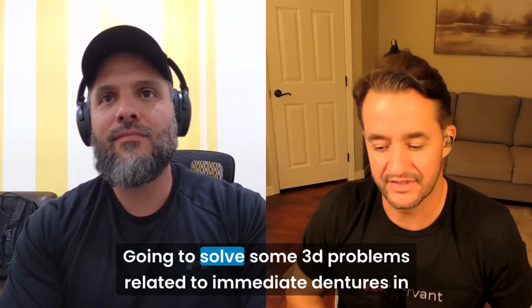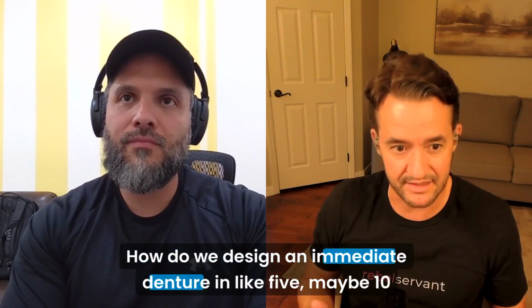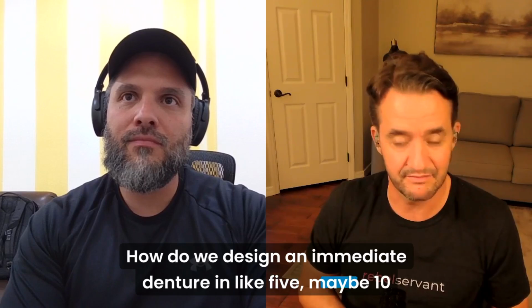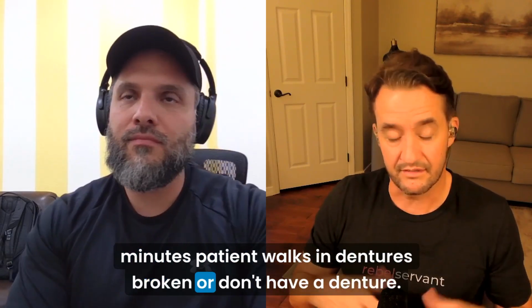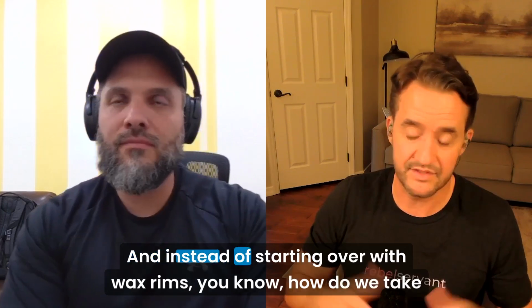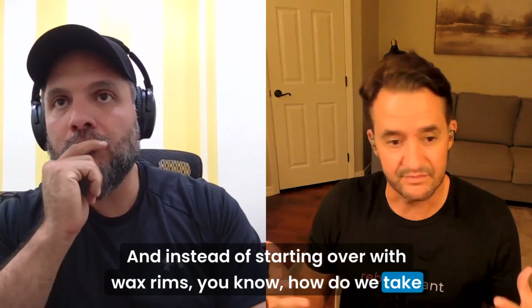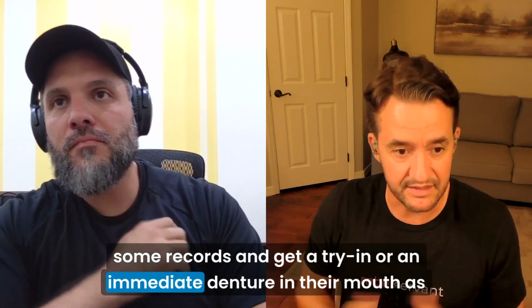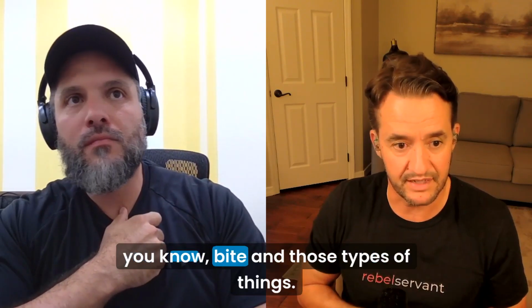Going to solve some 3D problems related to immediate dentures in exocad. How do we design an immediate denture in like 5, maybe 10 minutes? Patient walks in, denture is broken, or you don't have a denture, and instead of starting over with wax rims, how do we take some records and get a try-in or an immediate denture in their mouth as soon as possible so we can verify bite and those types of things.